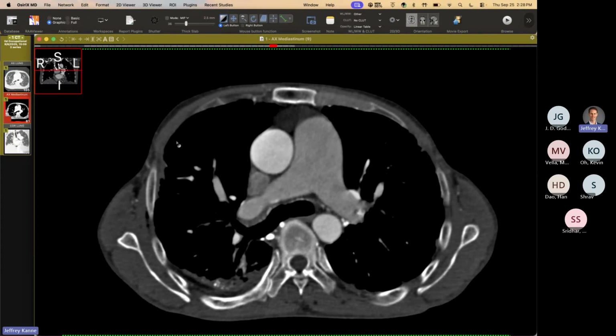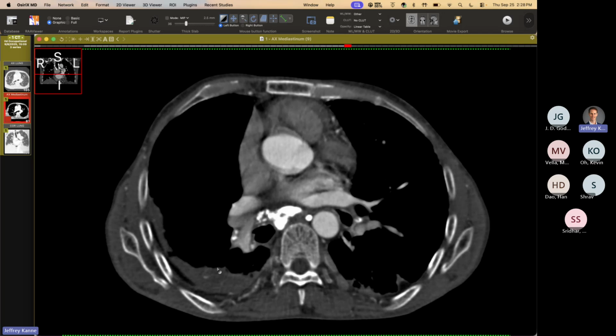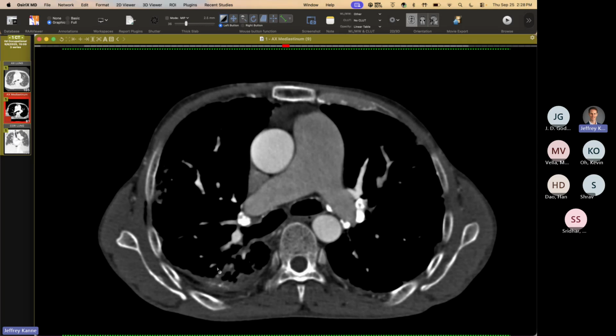I think he has three different things. There's some of the calcifications that may be from aspiration, but anyway, it was just odd. Sometimes you get these patterns of lung disease, and you have to realize it's not one, but two or three, all mixed.